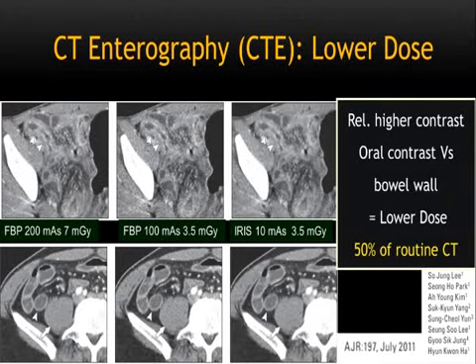Okay, CT enterography is another place where there is higher contrast. And this is kind of a negative contrast because in this exam, many places would administer a low density contrast. They will distend the colon or they will distend the intestine with that. And it's typically done for inflammatory bowel disease such as Crohn's or ulcerative colitis. In this case, you can see that there is thickening of this small intestine loop here. And again, you can see the same.